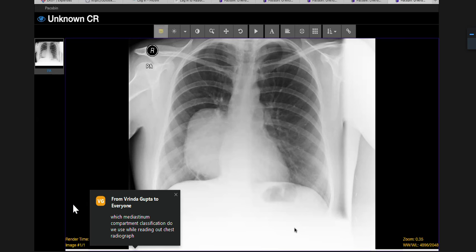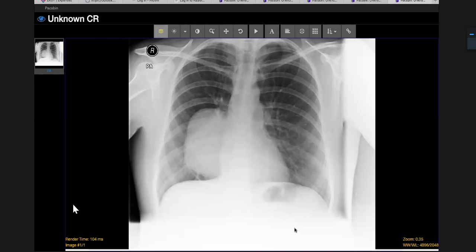So remember again, if we just pause there. Anytime you'll usually be given an X-ray first, and unfortunately in today's world, I'm the same really. When I see an X-ray like this, I'm already thinking about the CT, so I don't spend too much time because I know that's what's going to happen next. But in the exam they want you to get as much information as you can from this radiograph. We've already said that we think it's mediastinal, and in the posterior mediastinum, and I entirely agree with you because you can see the heart border, as you said, therefore it's not in the anterior mediastinum, and you can see the hilum overlay sign, therefore it's not in the middle mediastinum. That only leaves a posterior mediastinum.